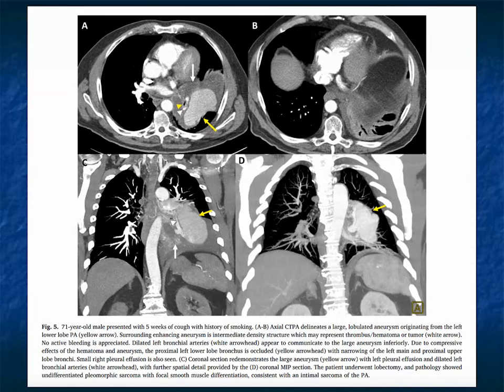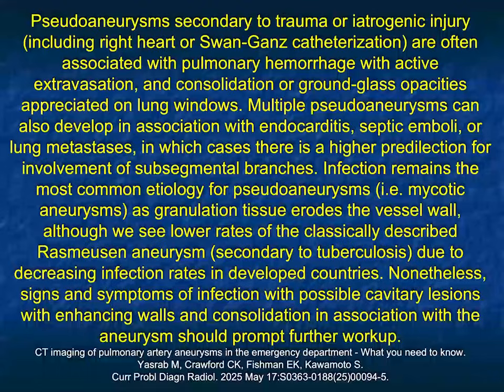This patient underwent lobectomy, and pathology showed a sarcoma in part, but also this large pseudoaneurysm, very nicely shown.